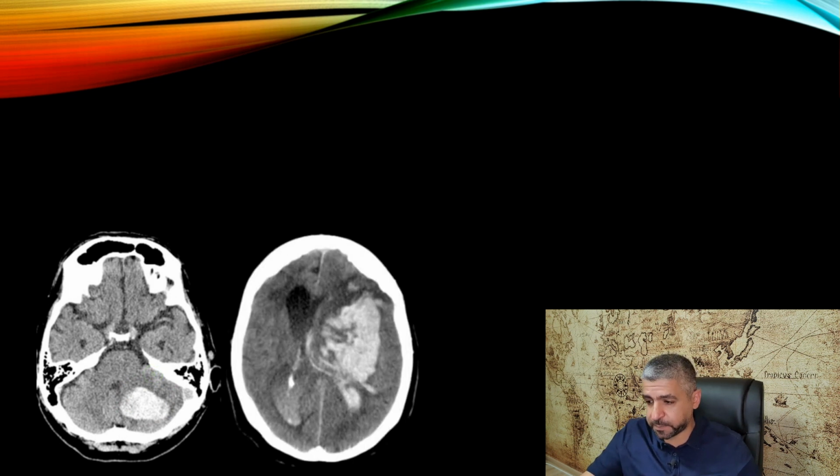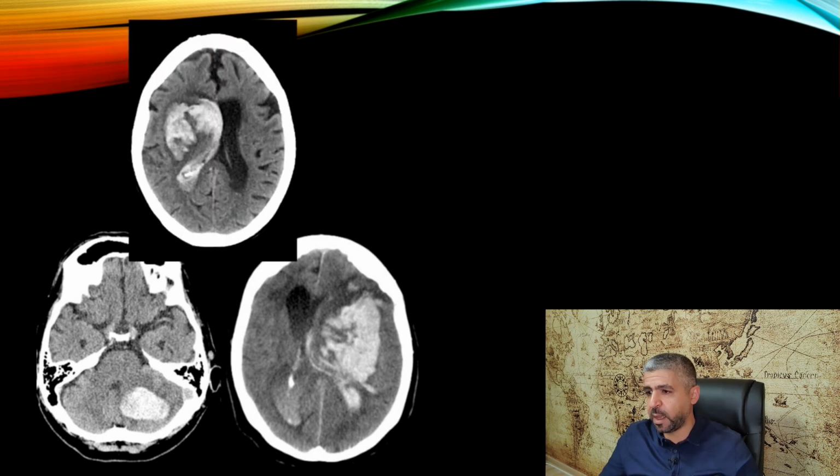So let's see some examples of intraparenchymal hematomas. For example, here you can see an intraparenchymal hematoma within the cerebellum, and it's well defined and there is no mixed hyperdense, hypodense material, indicating it's not active bleeding, okay? Another example you can see here, it's a big hematoma, and obviously there is a swirl sign here with surrounding edema, compressing the ventricle, causing herniation to the opposite side, indicating a large intraparenchymal hematoma, and this is within the basal ganglia. Let's see another example.